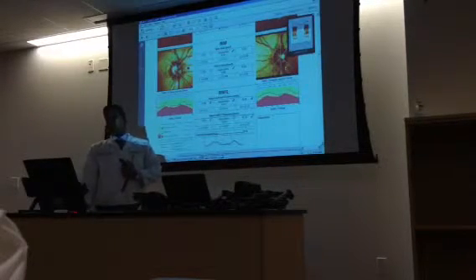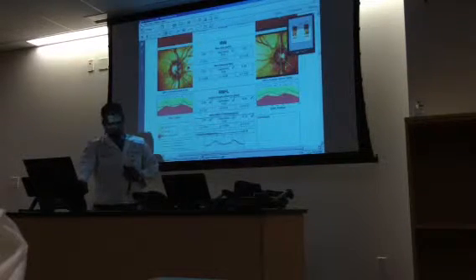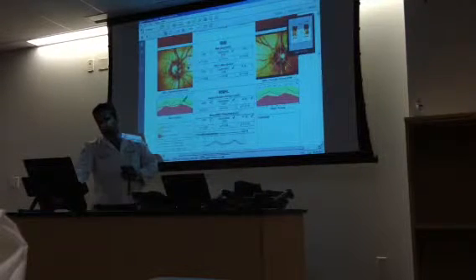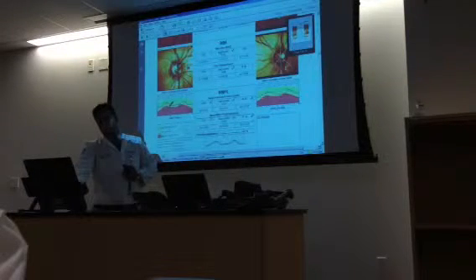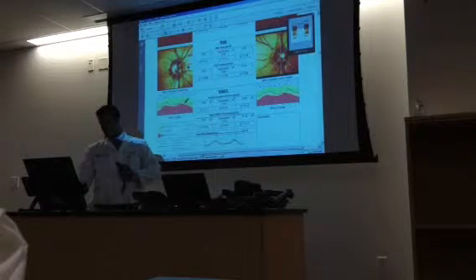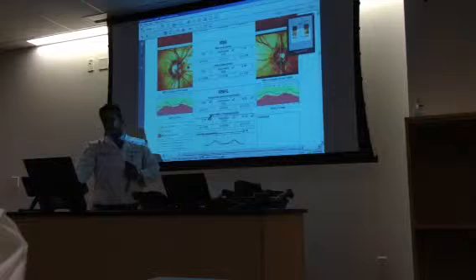But if you want to learn how nerve fiber layer is represented, it sort of gives you a double hump pattern. You can see that it actually looks like a first hump and a second hump. If it falls within the green, it's normal. If it goes down to yellow, it's borderline. If it goes into red, it's outside normal limits. Mean retinal nerve fiber layer thickness is obvious.